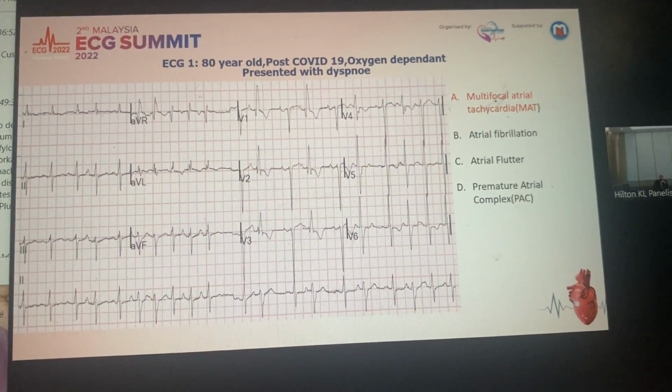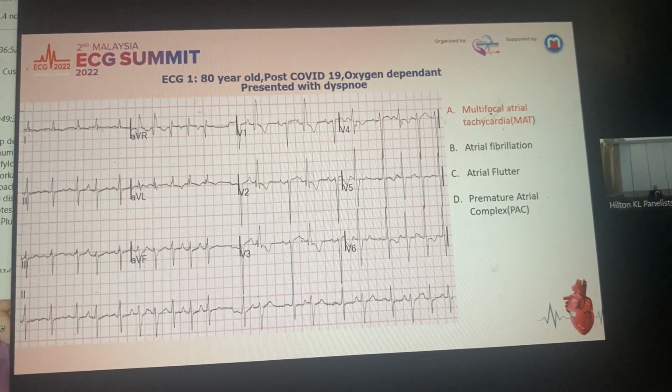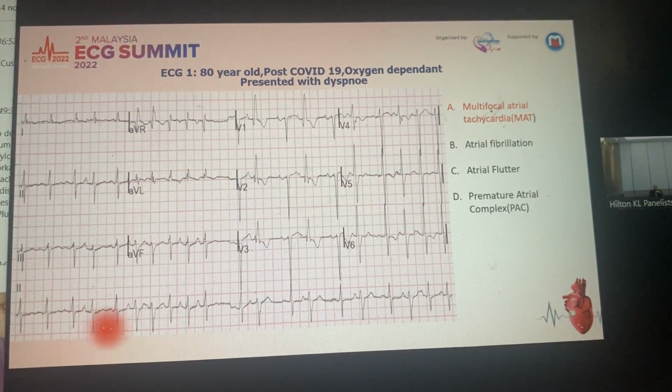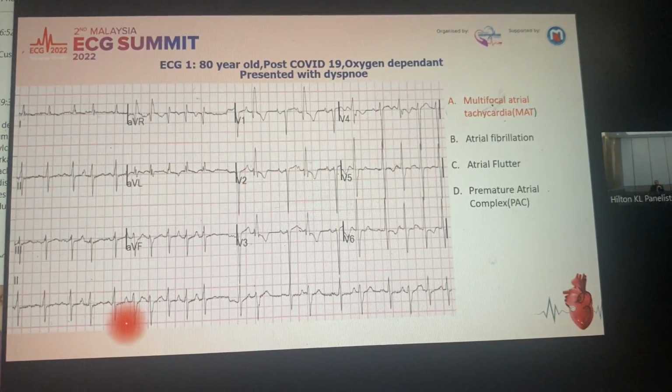This is an 80-year-old post-COVID patient. All right. So you can see here, the correct answer is multifocal atrial tachycardia. You can see there is a narrow complex tachycardia. And then, why multifocal atrial tachycardia?